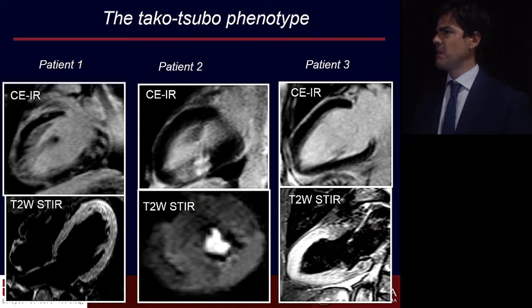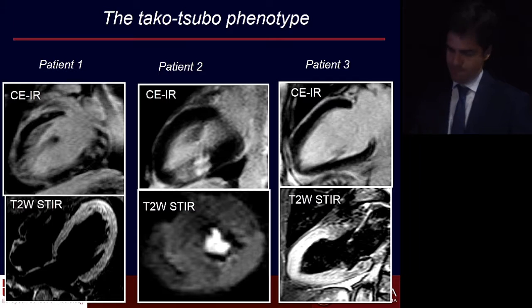Do you think it's ischemic, patient 1? No. Okay, there is a majority of no. Second question, do you see edema? Who votes for yes? I see edema. Okay. Let's keep these 2 pieces of information apart.